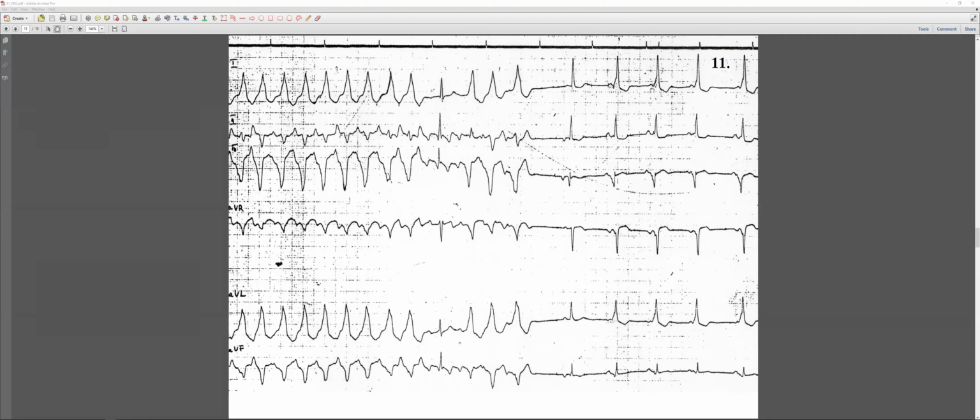Because we see the end of the tachycardia ending suddenly, we are assuming this is... I'm sorry, once again. If we see the beginning of the tachycardia starting suddenly or ending suddenly, it's an AVRT. So that's a paroxysmal tachycardia. Now, you can start with the right side because that looks normal. So let's start with the normal one.